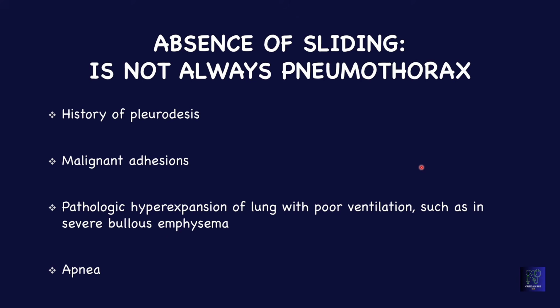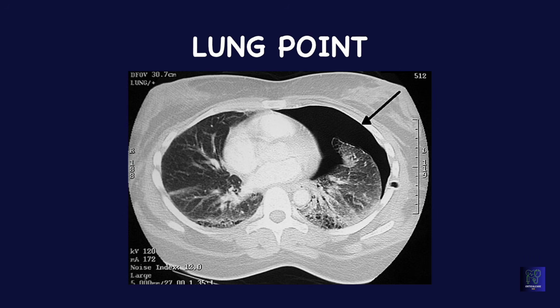All the air that is going in through the tube is only ventilating the right lung. So if you do a point of care ultrasound on the left side, you're not going to see sliding. It is not because there is a pneumothorax, but it is basically because there is no ventilation happening in the left lung. A finding that is specific for pneumothorax is lung point.